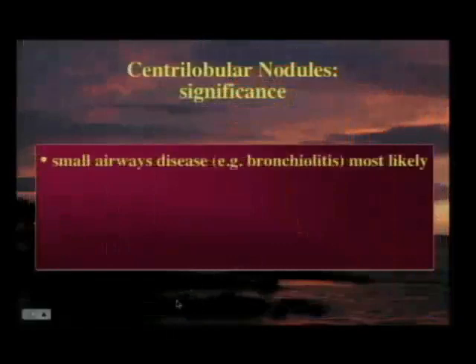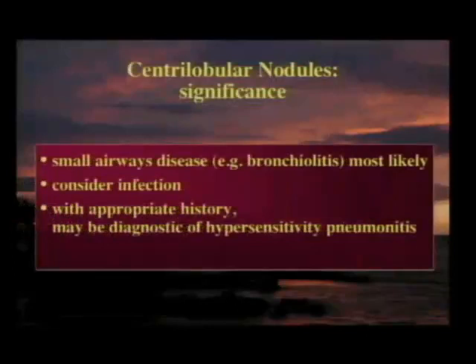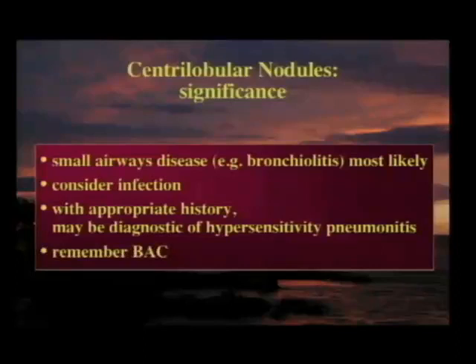Okay, the significance of this pattern, well, it's usually going to be a small airways disease or bronchiolitis. Consider infection, it's probably the most common cause. In a patient with an appropriate history of exposure to birds or mushrooms or fungus or something of that sort, the appearance may be diagnostic of hypersensitivity pneumonitis. Remember BAC. Do not forget the possibility of endobronchial spread of tumor when you see this appearance. Those would be the three most likely causes, the three things I would list in differential diagnosis when I saw this pattern.